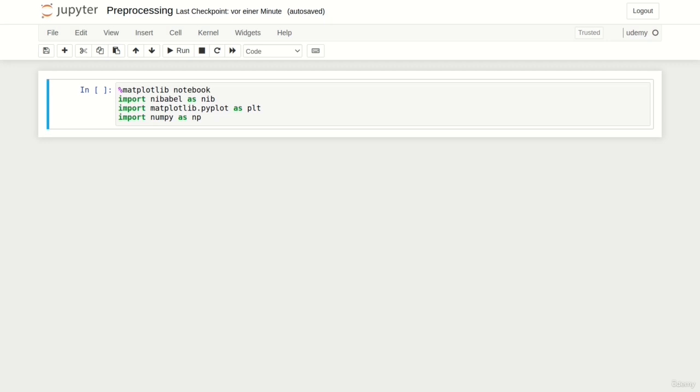To demonstrate this, we will use a brain MRI scan distributed by the IXI dataset. We already provide this file in the corresponding directory. In addition, as usual, we include the link to the dataset as well as the corresponding license in the Jupyter notebook. To address this issue, we use the following libraries.